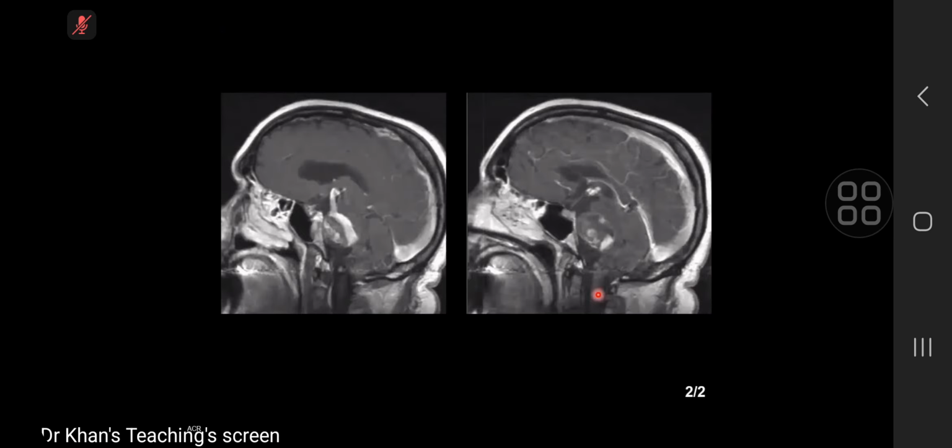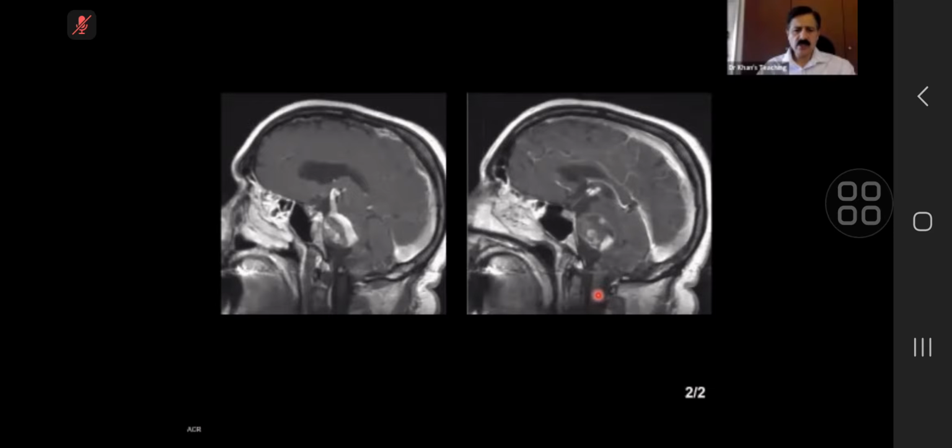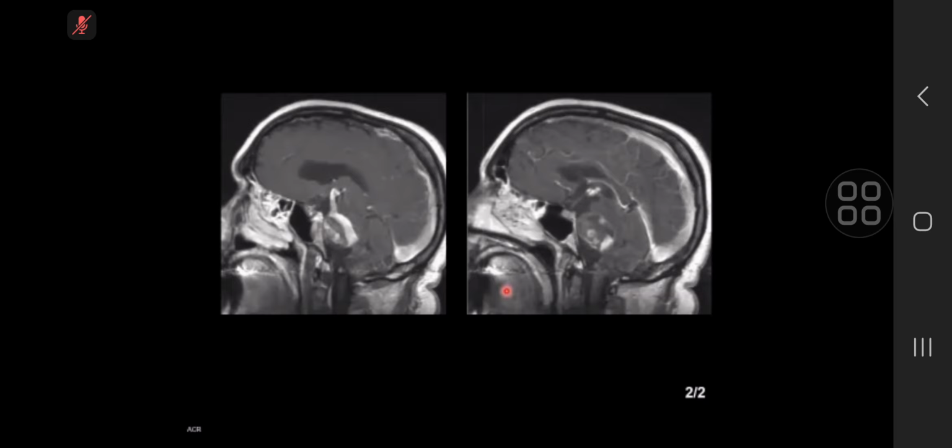Okay. Now, on a contrast enhanced MR, you can see what is happening inside. Can you describe it, and what do you think is happening? So on the contrast enhanced sagittal images, we can see that there is high signal likely to be contrast within the abnormality, in addition to areas of low signal more anteriorly, which may represent thrombosis.